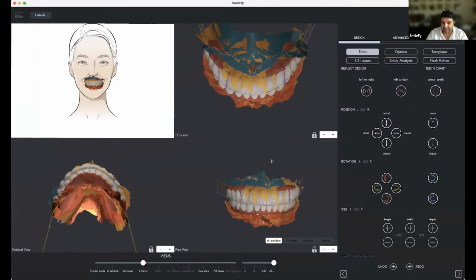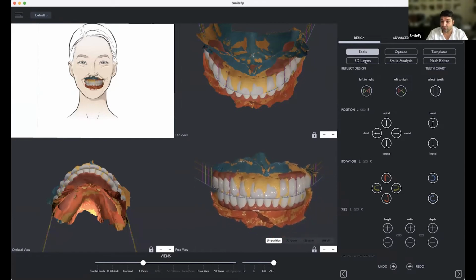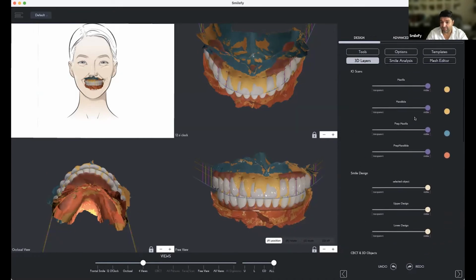Then we can design. So we need to check if there are more workflows or more real-time situations. And then we can create this workflow so that we make sure, at the end of the day, we really cover everything that we need to cover. And we can create very, very specific workflows and everything that we need.